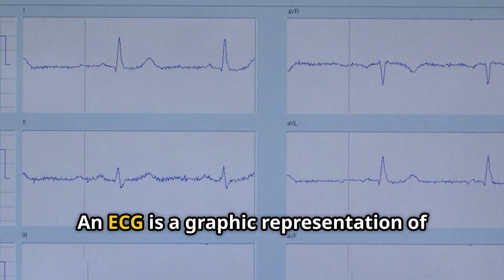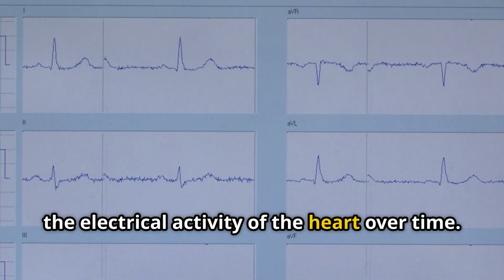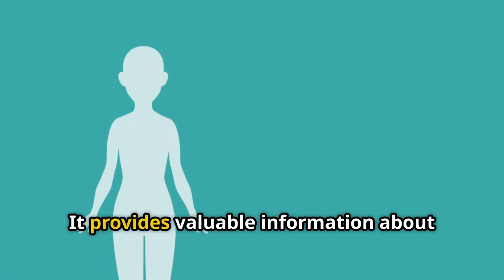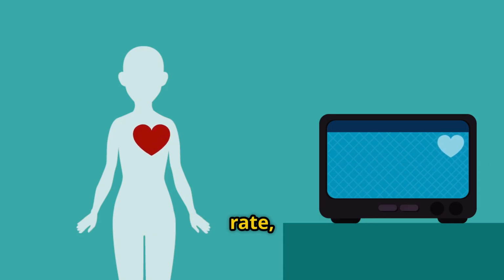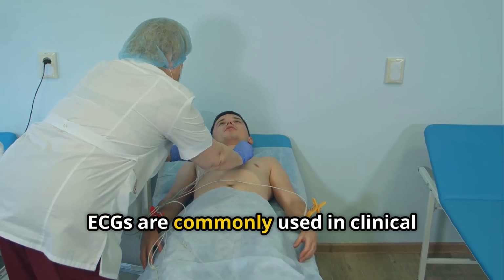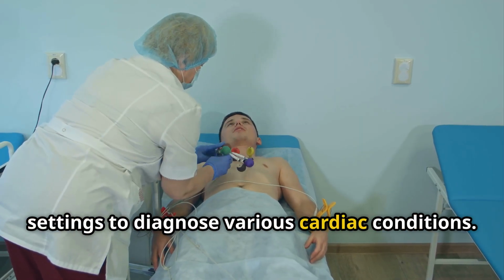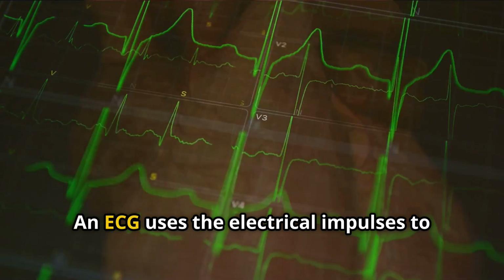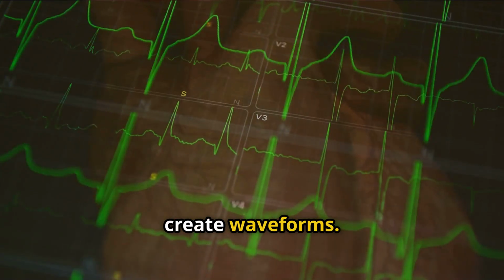An ECG is a graphic representation of the electrical activity of the heart over time. It provides valuable information about the heart's rhythm, rate, and electrical conduction pathways. ECGs are commonly used in clinical settings to diagnose various cardiac conditions. An ECG uses the electrical impulses to create waveforms.